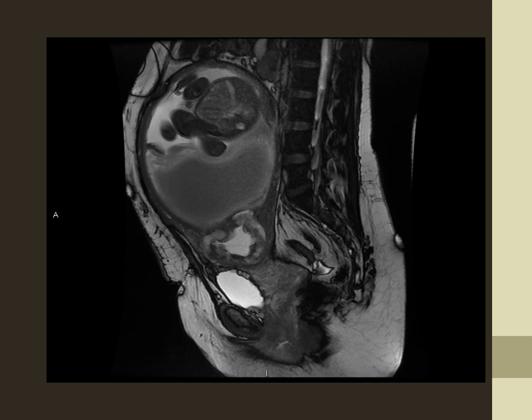Subsequent follow-up on MRI confirms our suspicion of the subchorionic hematoma, which is shown here. In addition, there was also this structure which we didn't really know the cause of, but subsequently found that this was due to a demise twin and that occurred earlier. So putting the two together, we think that this is probably the cause for the hematoma.